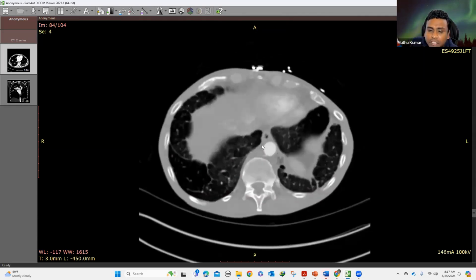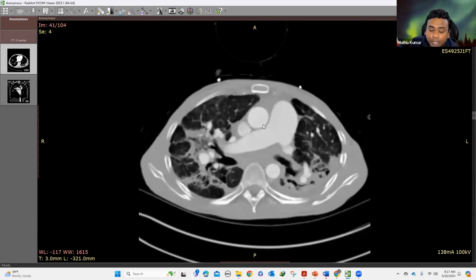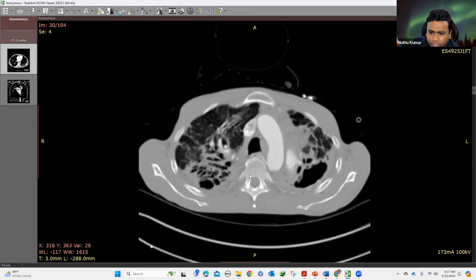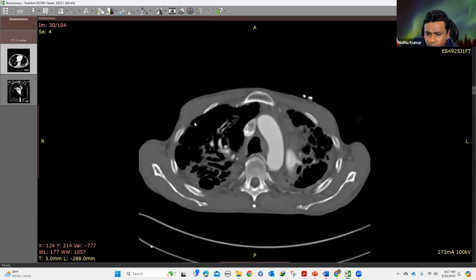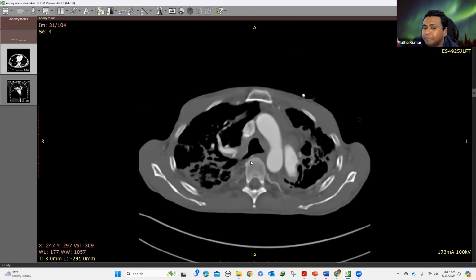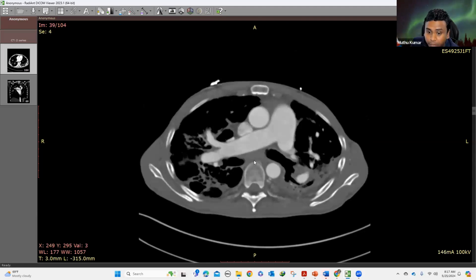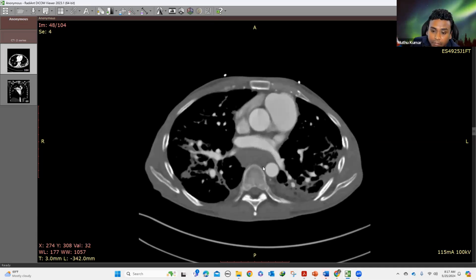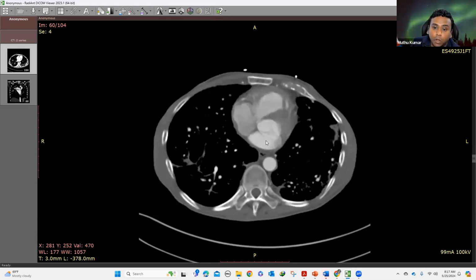The other important point, when these patients have a history of chronic sarcoid and are in the fibrocavitary stage, the important thing you need to look for is the prominence of bronchial arteries. You have to mention this in the report when you see prominent bronchial arteries, because this will keep the patient on a watch list. And also this patient who has bronchial artery hypertrophies is at high risk for recurrent pulmonary bleeds and recurrent hemorrhage. So always mention it.